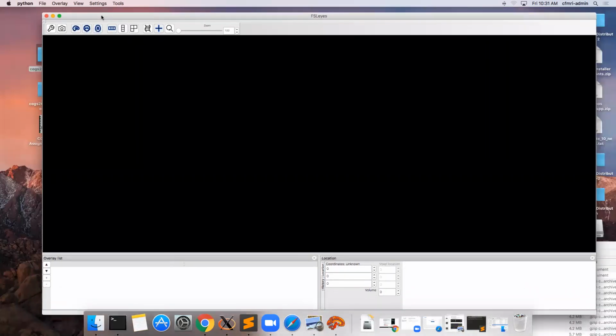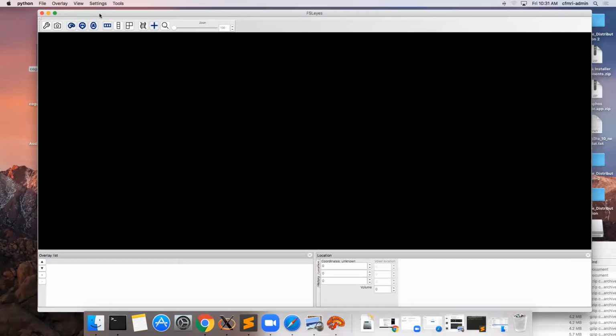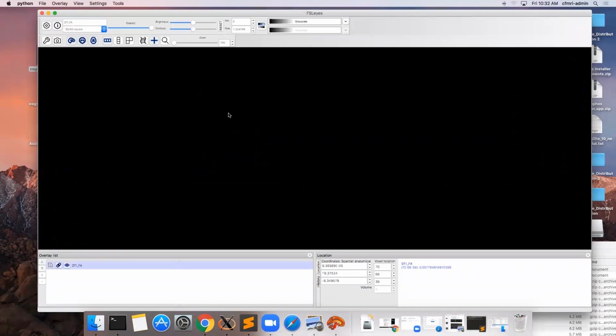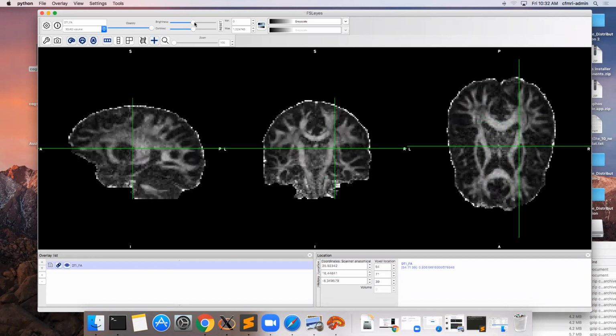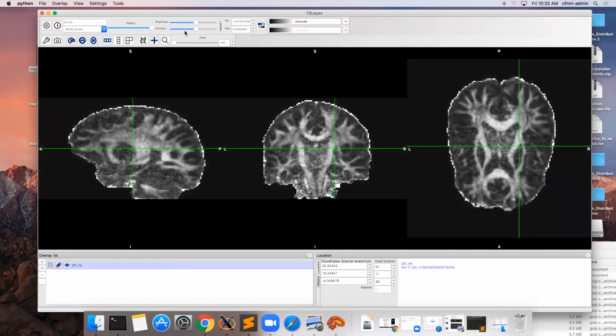Right, so you guys probably have spent time with FSL at this point in this course, I would imagine. So you probably know how to pull data in, and honestly, I don't spend a lot of time with FSL, but I'm figuring it out. So, all right, you can view these data sets here too. The orientation is different. The images are the same. You can play around with brightness and contrast here. And again, I just can never get it exactly how I want it in FSL for some reason.